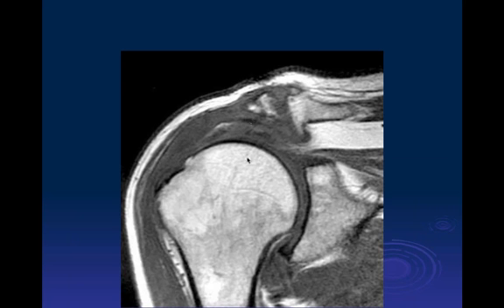The distal clavicle, is that hook there, and then it looks like there's mass effect certainly on the supraspinatus muscle by that hook, the distal clavicle.